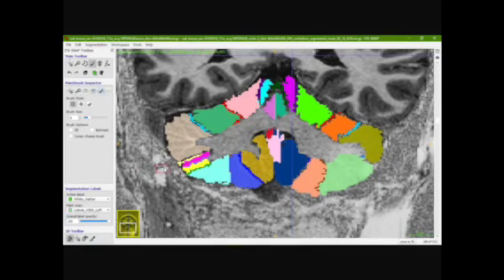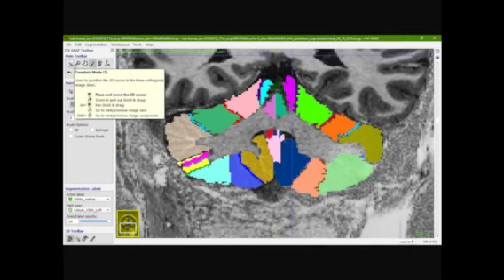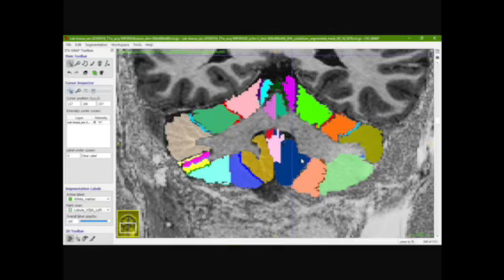If you also want to go to another view and you want to mark a specific point or go to a specific location, you can use the crosshair mode. You click on that, and let's say here the level 8A left is right here, right? So you just place the cursor there, and as you can see, this is going to create these axes where the specific location that you want to look for is.